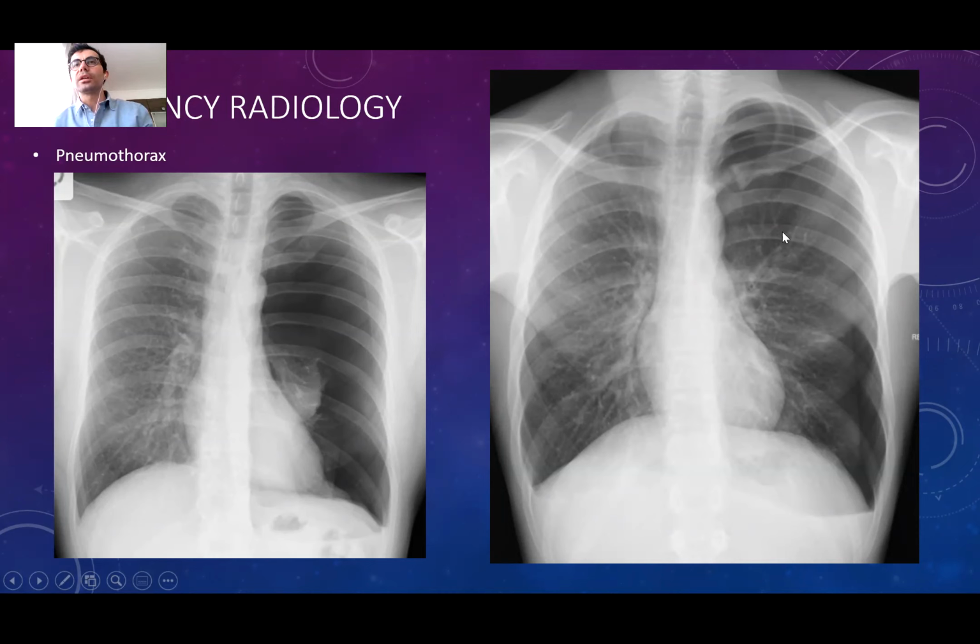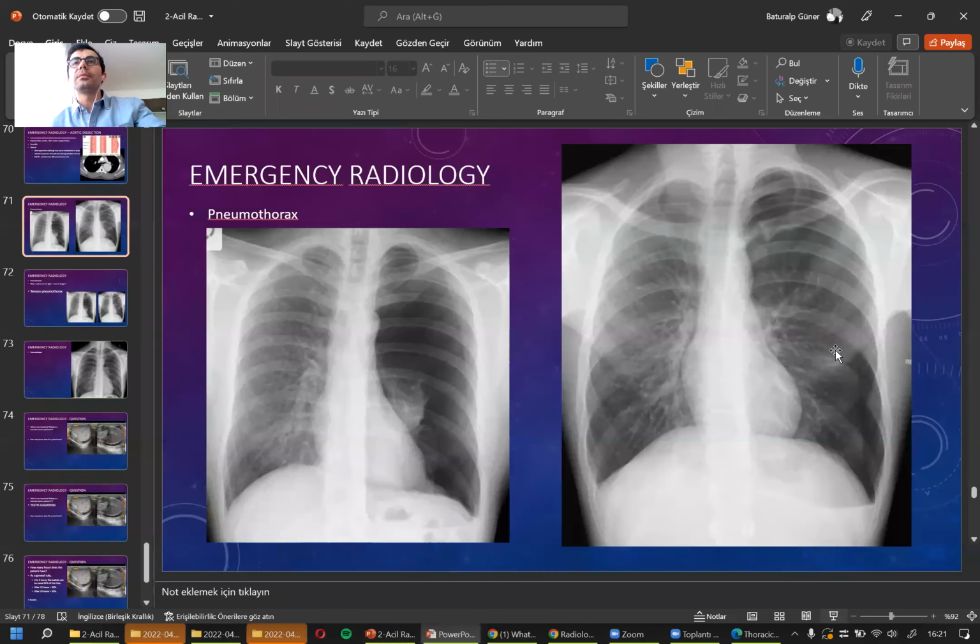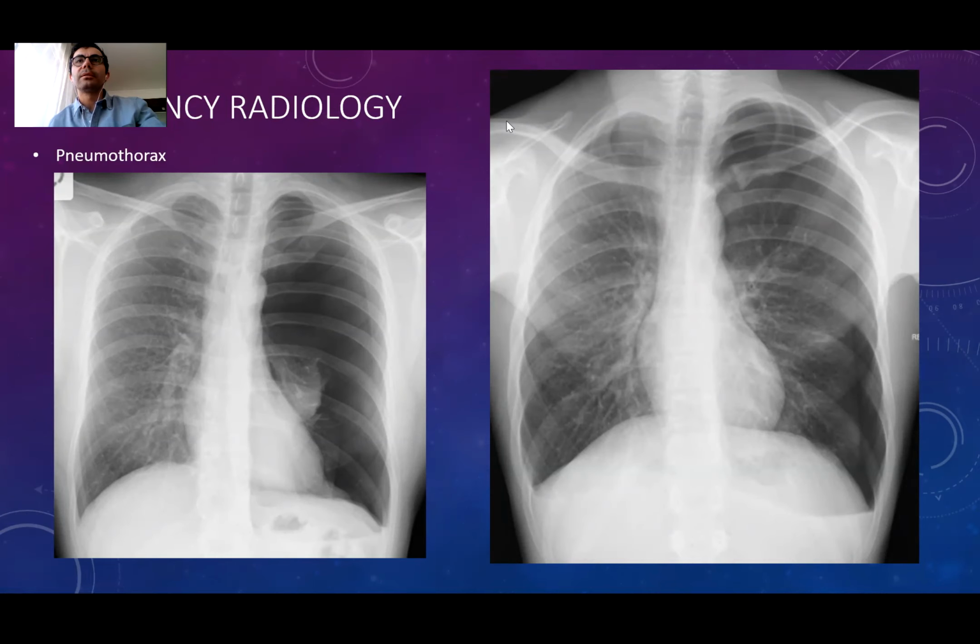And in this case, which is quite minor, because I can see the lung parenchyma, the air is still present there, and there is only some minor amount of volume loss. So the lung is actually here. So there's free air which has escaped to the thoracic cavity, and the lung didn't collapse yet. But looking at these two images, the one on the right is more in danger. Can you guess why? This one is in more critical condition.